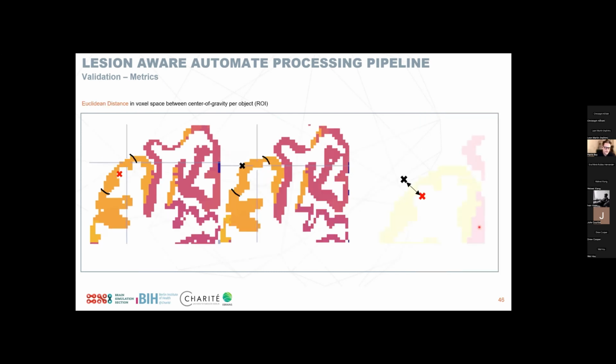And also because we want to get some idea about where the region is actually located in the brain, we compare these two. If we think about the center of gravity for this region, for example, we have a fairly big chunk here, fairly big chunk here. If we take the mean in terms of the center of gravity, we might end up somewhere here. If we take this for the other parcellation, there's a big chunk here as well.